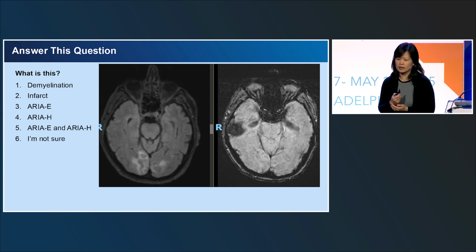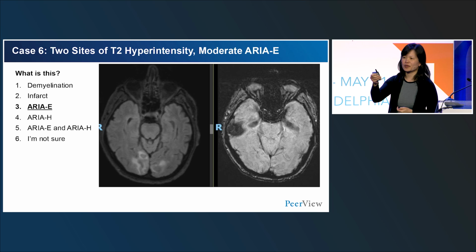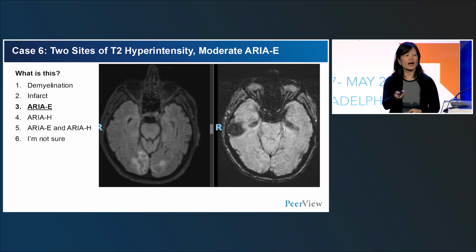And here's your next question. So some people think ARIA-E, some people think both ARIA-E and ARIA-H. And I heard someone yell out PRES. So it does look like PRES, doesn't it? It has that same sort of distribution, and this is why there's a lot of controversy as to whether or not ARIA is really just a form of PRES, right? So that's still being sorted out, but indeed it does sort of look like PRES. In this setting, we call it ARIA-E. There are 2 sites involved here. They're both less than 10 centimeters. On the SWI, those are actually just veins. They're not actually siderosis or microhemorrhages. So this was a case of moderate ARIA-E.